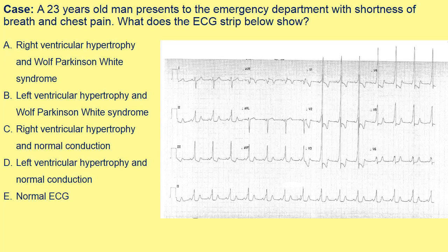Okay. So if you look at this ECG, obviously you do the sequence, but I've already given you the option. You can see that there's actually very long QRS complexes on the right leads. So you should start suspecting, could there be possible right ventricular hypertrophy? Look at the long R waves. The R waves are quite massive on this. So there's possible right ventricular hypertrophy.